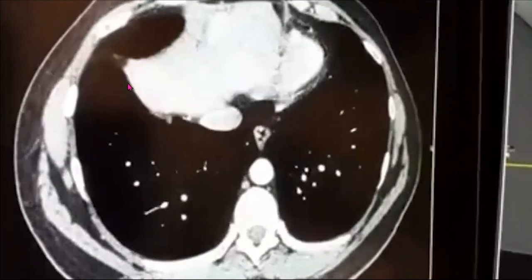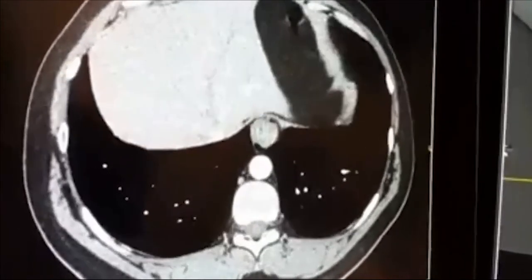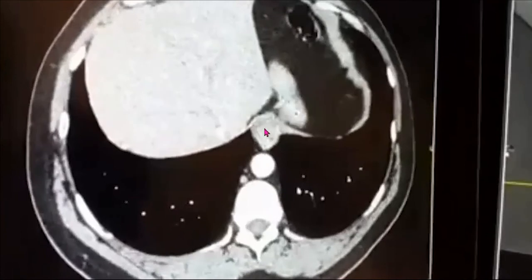Now, as you can see, a new structure is emerging. This is the liver. Okay, so now we have just entered the abdominal cavity, and we can see esophagus over here. You can still see descending aorta. So let us trace further. Now you can see here the esophagus is just going to open into the stomach, and this part is the stomach containing air and fluid, and this is the liver on the right side. And still we can see this descending aorta, and let us trace further.